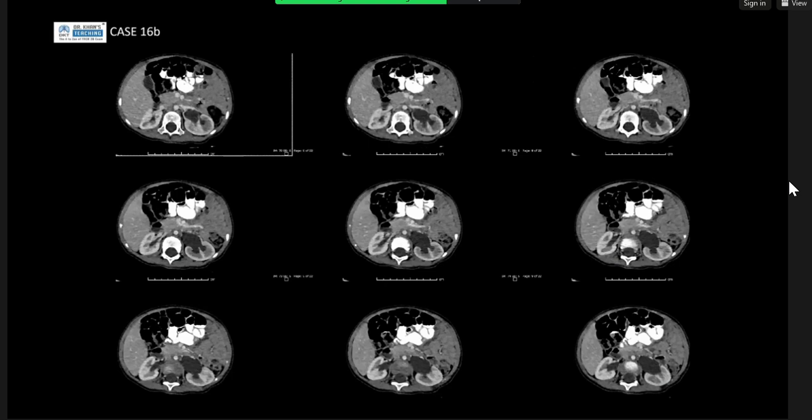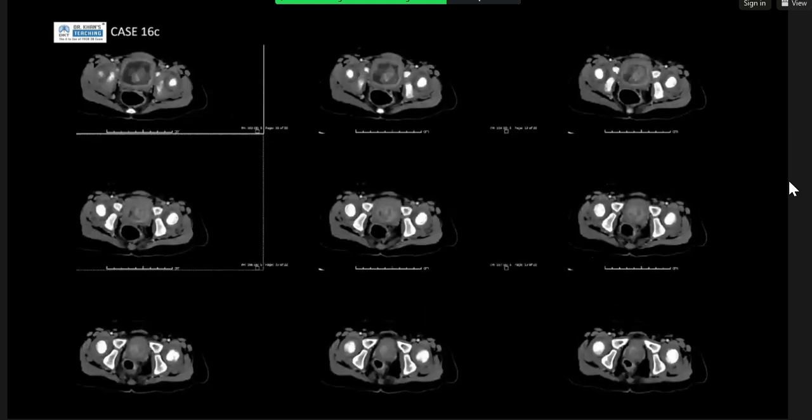Okay, I've got another one. And the previous findings seen on ultrasound, there is a heterogeneously enhancing polypoidal mass lesion within the urinary bladder causing upstream hydroureteronephrosis. I think the age of the patient is 7 years. Yes, right? No, 1 year old. 1 year. So my differential diagnosis will be, I think, have they done any Doppler, color Doppler over the bladder?